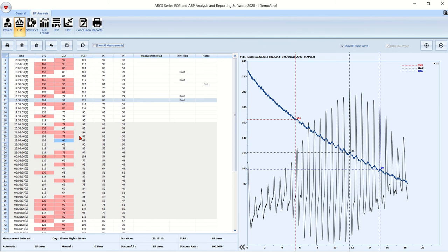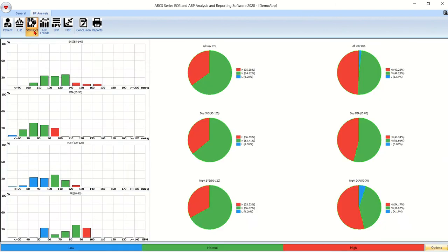Welcome back to the third educational video on the ambulatory blood pressure monitoring within ARCS 2020. The last video we left off having completed the list function. Now we'll move to the statistics function.